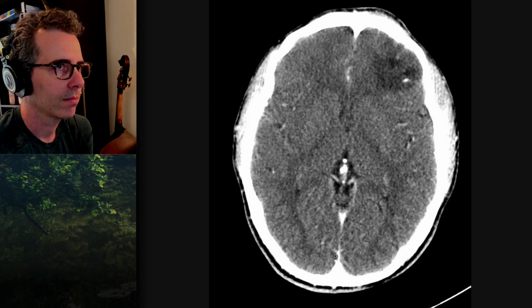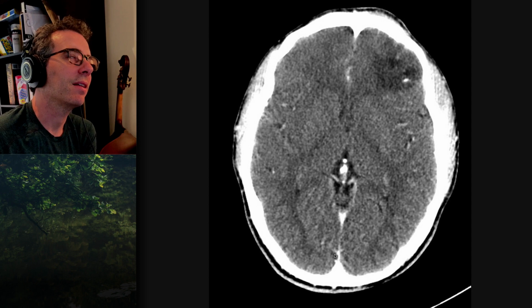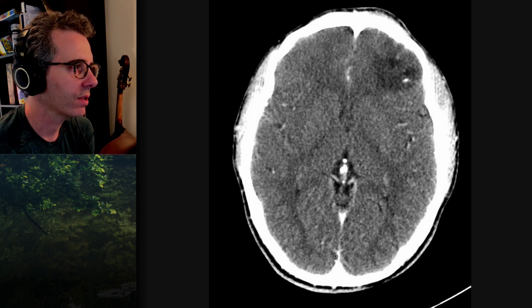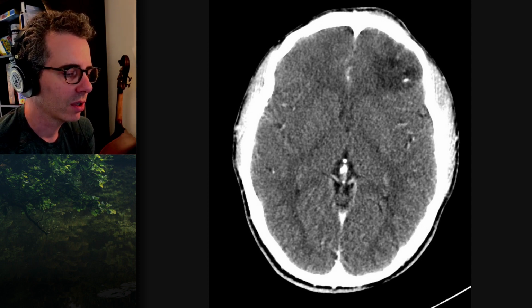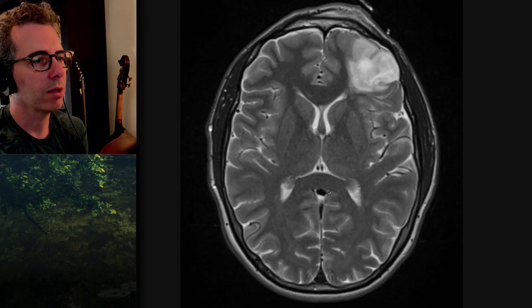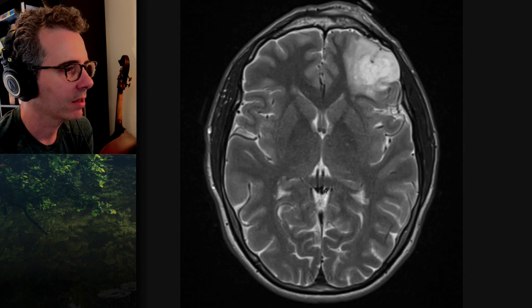Yes. Or if for some reason this young person had a prior CT brain to compare to, that'd be useful, but I doubt it. If they had a prior CT and it showed an abnormality there, it would probably mean they already had a diagnosis. And if it was normal, unless it was very recent, it wouldn't help very much, because it could have grown in the interim. So MRI. Tell me about the MR. So this is done the same day, after maybe.